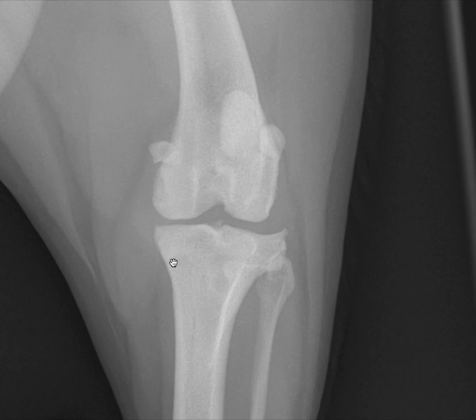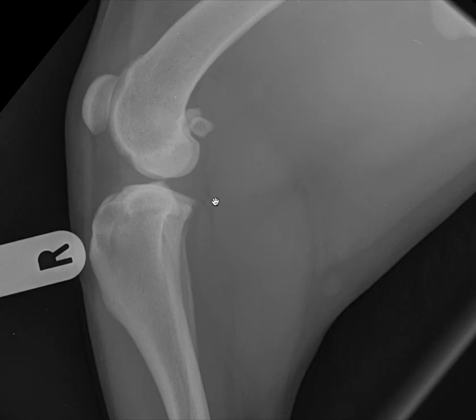The other thing that's in the radiographic joint space, coating the ends of arthroidal joints, is articular cartilage. So what I'm tracing now with the thumb is the subchondral bone margin. But next to that, and within the radiographic joint space, is the cartilage surface. So when we think about joints on radiographs, I'd like us to remember that there are important structures in there which we're not able to see within the radiographic joint space.